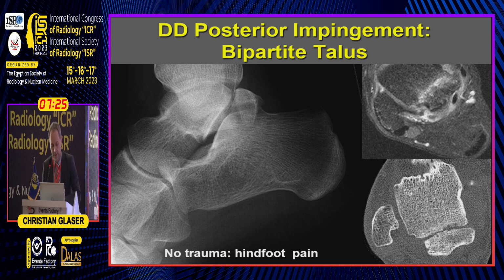Now, I've included that case in the differentials because in essence it's not true impingement, but impingement caused by a bipartite talus. So that's sort of an atavism, a non-fused bony center. And here, that previously was the hallmark of CT, showing those erosions, these irregularities in that synchondrosis, indicative of the altered biomechanics. So this is our approach to the function.